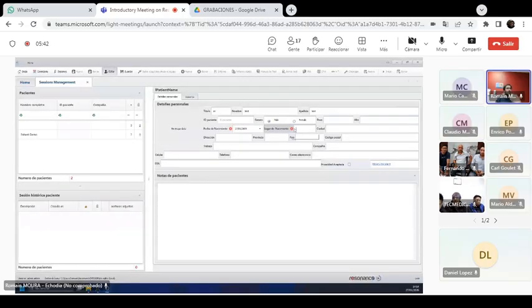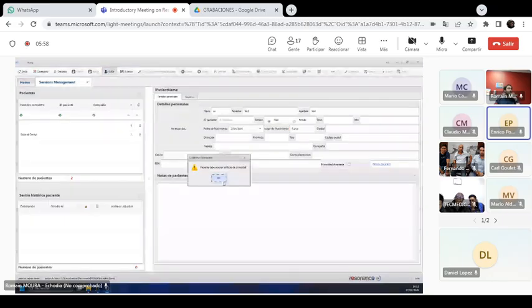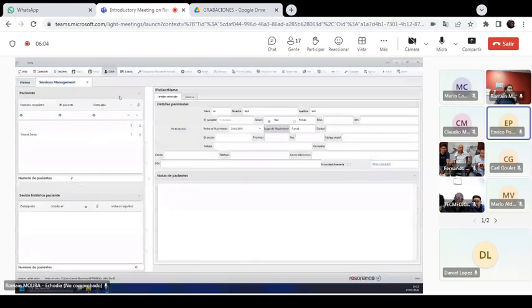This is the birth date here, I guess. Can you confirm? The birth date is the one that you just did, and this is the birthplace. Okay. We have removed the birthplace. It's not a mandatory field anymore in the newer version. Perhaps this is not the latest. It doesn't really matter. Yes, this is an old version. Sorry, I don't have the latest one.